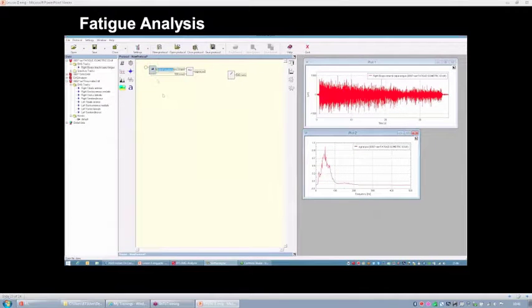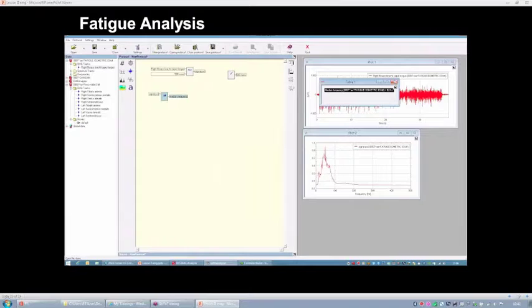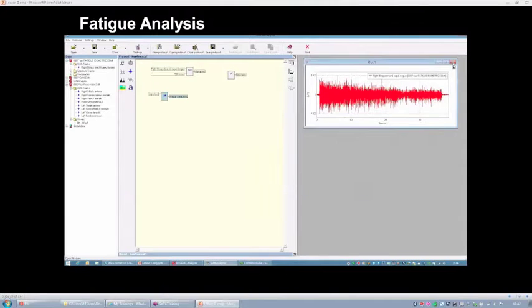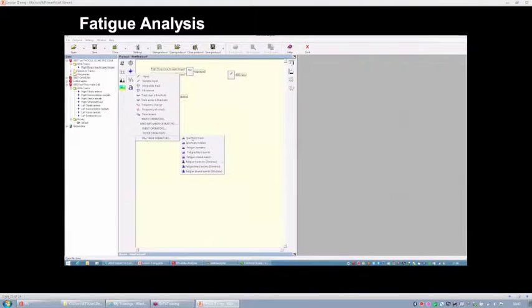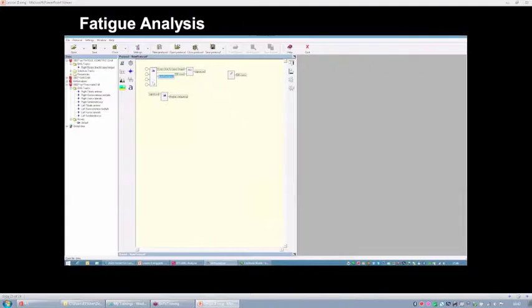So now we can, for example, compute the median frequency. And as you can see, it is around 50 Hertz, so 52 Hertz. So it's lower. The median frequency of this spectrum is lower than what you have in a typical unfatigued EMG spectrum.